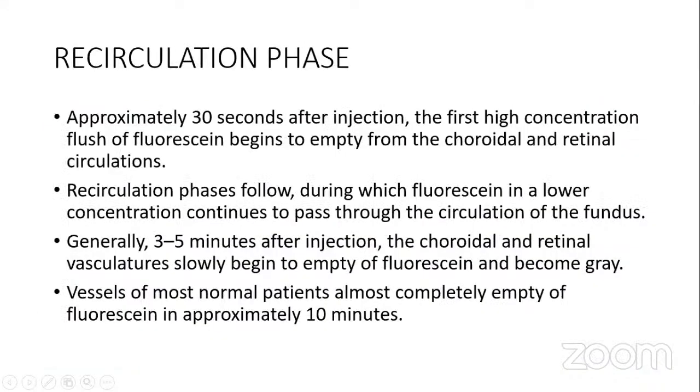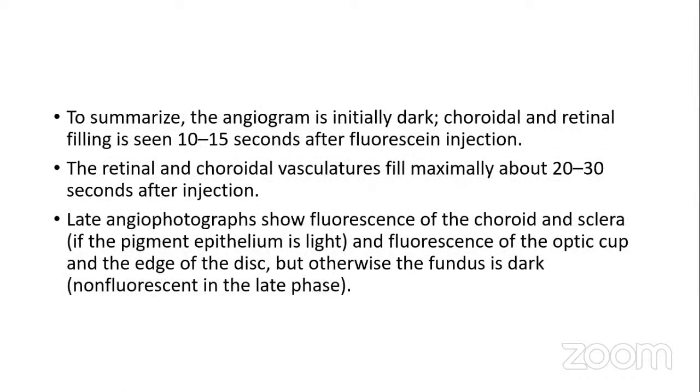So recirculation phase and everything, I said the late phases will be around 3 minutes. It takes 3 to 5 minutes to empty out. In some patients, 10 minutes. So depending on the pathology you have, you capture the first phases and then it's okay, let's wait for the late phase. And by the end of the day, you will know why you wait, not just take the first few shots and send the patient away. Because you already have the history of the patient, have a fundus photo, you know what you're expecting, you should know where to look for it.